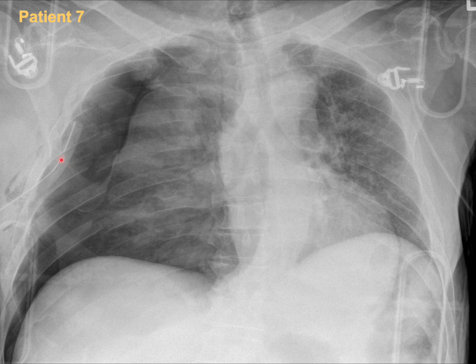You have to be sure that all the holes in the tube are inside the chest itself. So I think we need either to push it inside to be sure that there are no other holes out. And if we have a patient with pneumothorax who's still desaturating and still draining, continuously bubbling, the underwater seal is still bubbling with no improvement, I think we should start considering that this patient might have a tracheobronchial tree injury, and he might need more than one chest tube on the same side in another level. And if the patient is not improving, he might need to go for a bronchoscopy or surgical intervention.